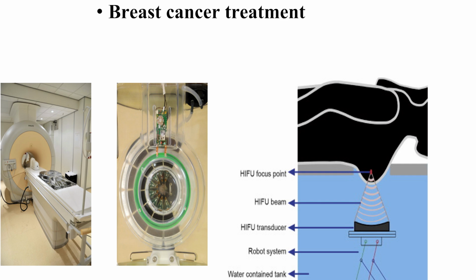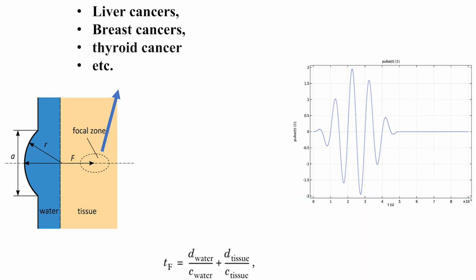And here also the breast cancer treatment via the same device, but here we have a box that contains a water tank, and the patient will be put in this rack so that the breast will be treated with the HIFU signals coming from the water tank.